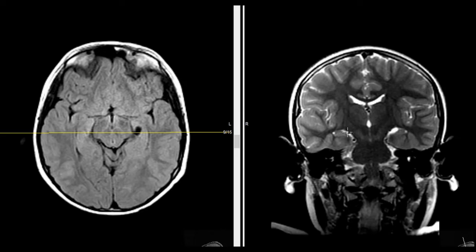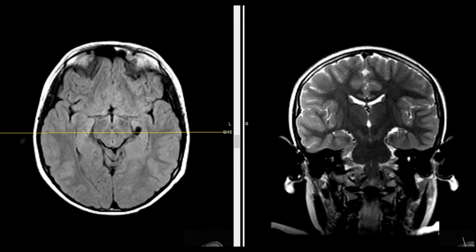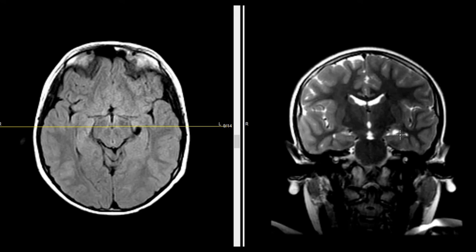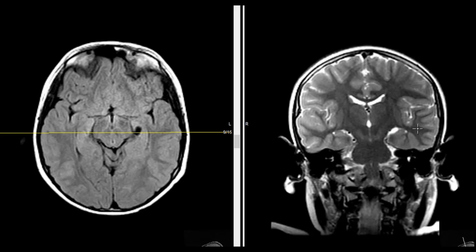We see them and wonder, gosh, could this be a problem? In a patient like this where they have a new onset of seizure and we see a little bit of mass effect, we assume that this is large enough now to be serving as etiology for a seizure. But a benign little fluid collection in the choroid fissure, producing mild mass effect on the left hippocampal formation, and again likely causing their seizure disorder.